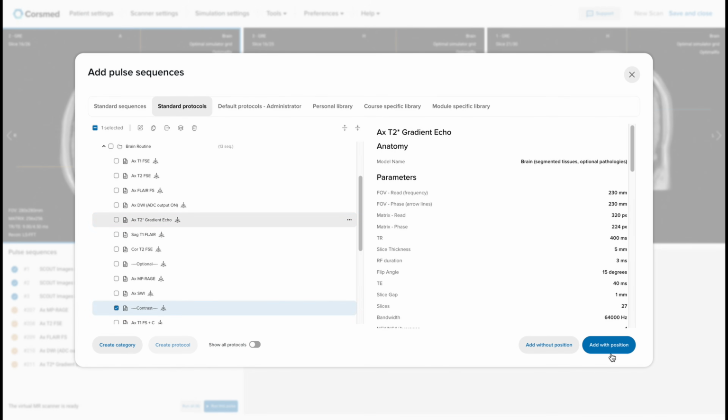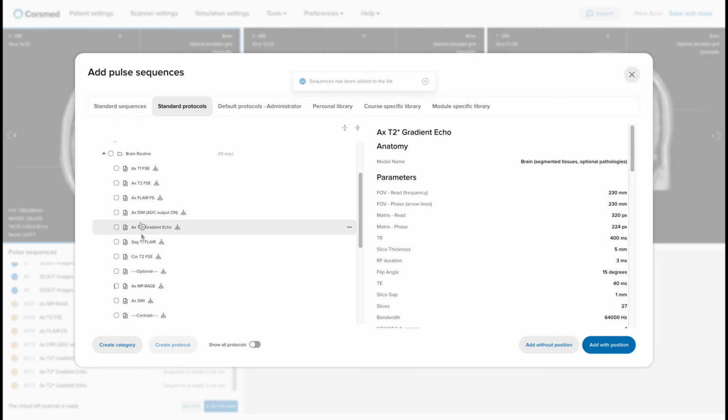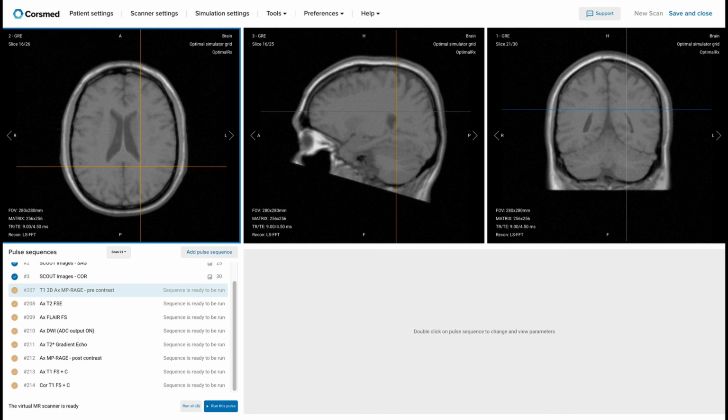At this stage is where we're going to inject contrast. After contrast, the 3D T1 sequence needs to be repeated. Then we'll add a T1 post-contrast in axial. As you know, contrast shortens the tissue relaxation times, which enables us to get very strong signal. Sometimes we even get hybrid imaging in T1/T2 because the fluids are hyperintense due to contrast, but the time to achieve that hyperintensity is much less because of the contrast effect on the tissues. Finally, we'll add 2 T1 post-contrast sequences in coronal and axial planes. So this is the entirety of the protocol.